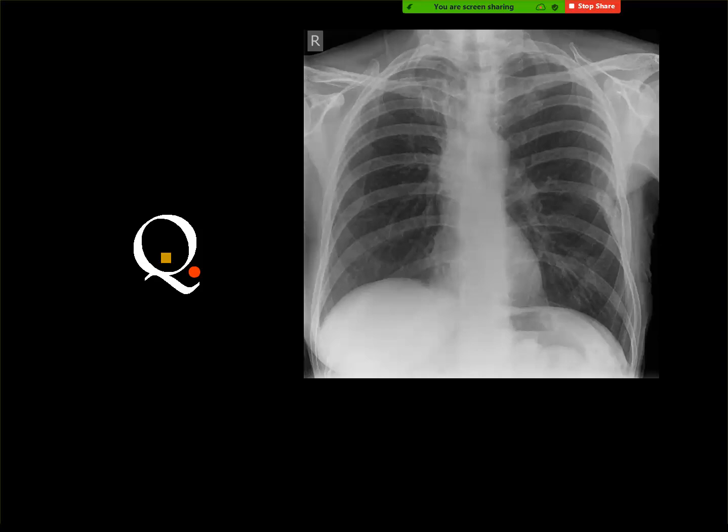Hemomediastinum. Normal. Right hilar shadow. Deep sulcus sign of the left costophrenic angle. No. Normal. I think there is some malposition. Normal. Yes. Look at the breast shadow. Yes, the breast is missing on this side, and you got a sclerotic deposit in this rib.